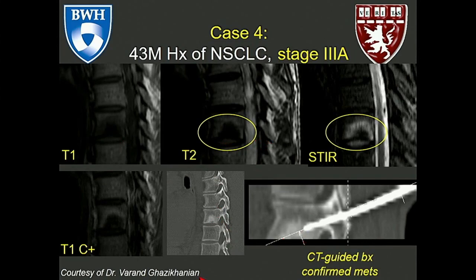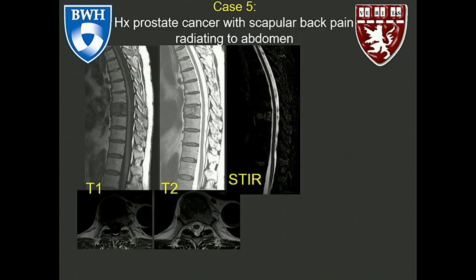And the biopsy confirmed that this was metastatic disease, and unfortunately for the patient, this upgraded them to a stage 4 diagnosis at that time. So again, a worrisome lesion when you see the halo sign. All right, our last case here.